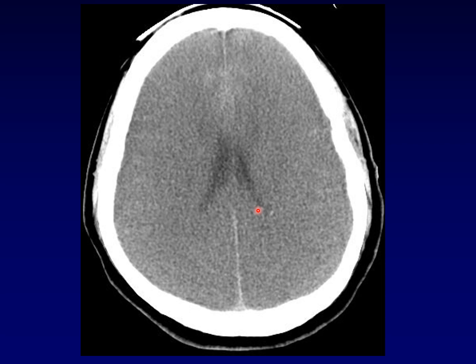Here's another thing to notice. You can't see that ribbon of gray matter that's supposed to be going all the way around the outside of the brain. And you can't see the gray matter that should be in the basal ganglia. It's all washed out. That's because this entire brain is like that triangle of the middle cerebral artery that we saw in the stroke. This is an infarct of the entire brain. This, unfortunately, is brain death.